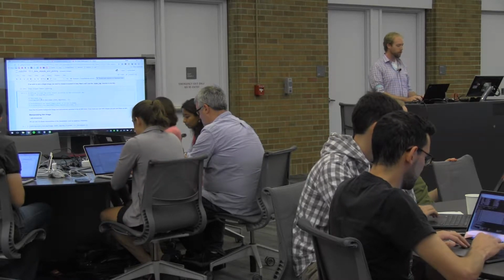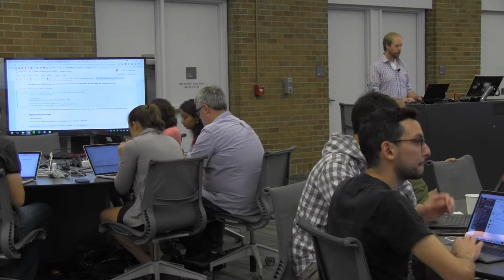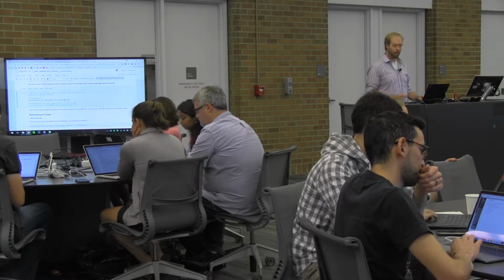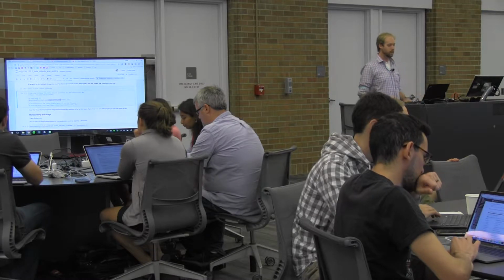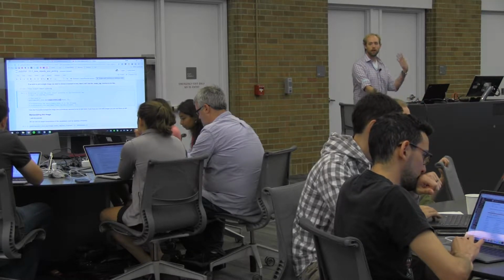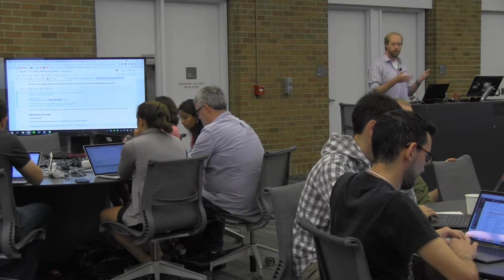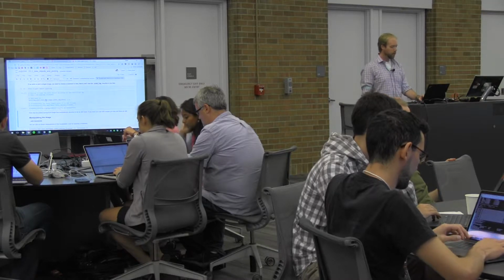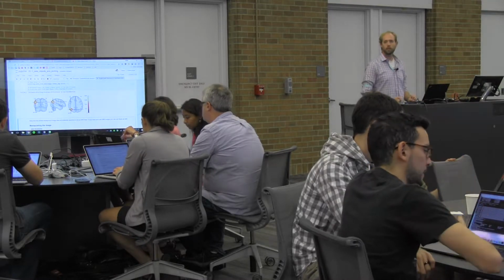So here we'll just call plot_stat_map onto the 4th image that's in this Nifti stack that we've got here. To do that, we're using this function here, index_image. This is a way to tell nilearn, I want you to go into this Nifti file and pull out the nth image for visualization. So we can run that, and we get a nice visualization of that.